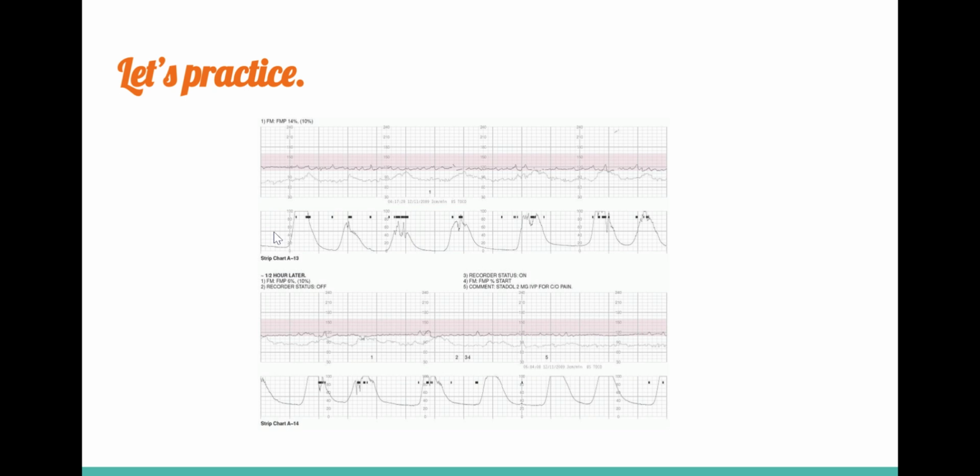If I'm looking at a 10-minute period, 1, 2, 3, 4, 5, 6, 7, 8, 9, 10, I have 5 contractions. And I can kind of live with that, but I'm going to keep an eye on this. If this woman starts to hyperstim, I'm going to have to do stuff, and that's for a different day. So that is our contraction frequency.